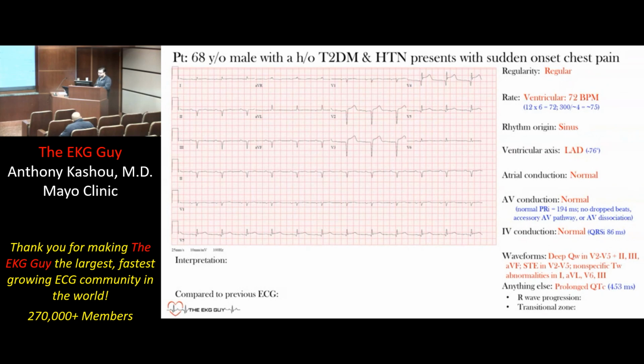All right. Now, R-wave progression. Okay, this is again these last two things in the precordial leads, R-wave progression. As we go from the right side to the left side of the precordium, the R wave should increase in amplitude, and you can certainly see that we don't have that here. All right, 2, 3, 4, and even 5, we have those Q waves that are pretty much predominating. Okay, so there's something going on, and we call that poor R-wave progression, which may be something that's going on in that anteroseptal region.